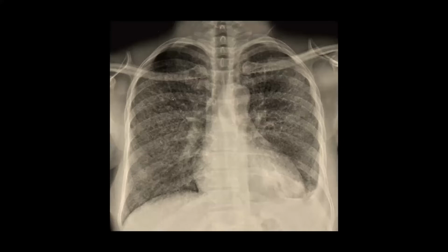But this pattern is certainly diffuse and is nodular. You might imagine that there are these tiny little, almost like rice grains that somebody threw at this chest and stuck. And then she also has this blunting of the left costophrenic angle, which would suggest a little bit of left pleural disease there. Don't see pleural disease in COVID-19, incidentally. So she had this chest x-ray that was attributed to COVID-19 along with her other symptoms, and she was sent back to jail.